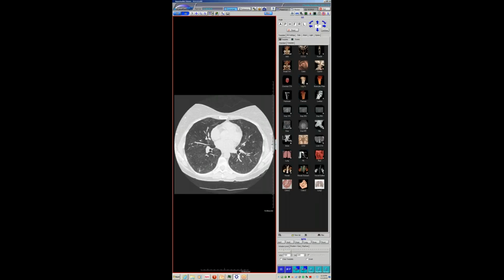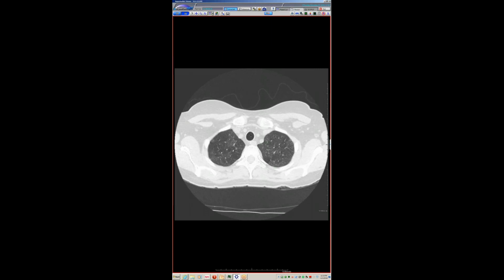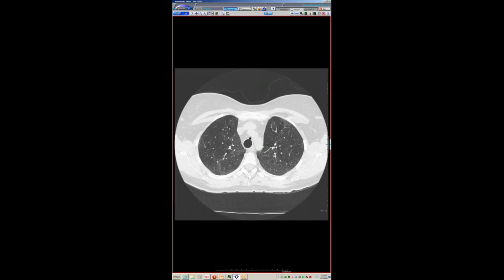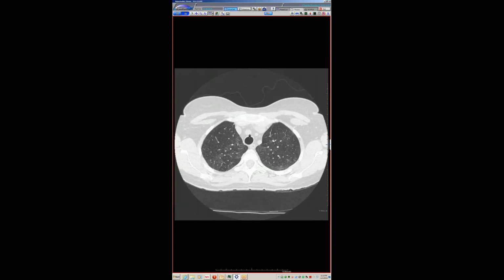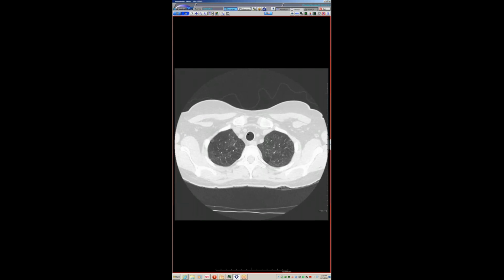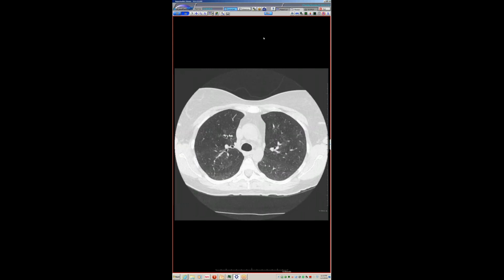Anyways, they biopsied her and they treated her, and you can see that the findings are improved. She got rid of the birds. The underlying disease is definitely improved, but we still have this underlying pattern with lower lobe ground glass, some areas of lobular sparing.